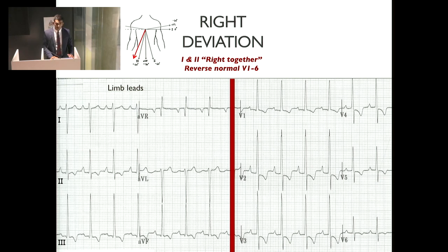If we examine the chest leads, the axis is shifted towards the right, causing a positive deflection in V1 to V3, and although V4 to V6 are still positive because the overall vector is in range, these are less positive than we would expect when normally comparing V4 to V6 with V1 to V3. In other words, the axis has reversed in the axial plane, so we see a reversal of the normal pattern in the chest leads. This ECG has no rhythm strip.